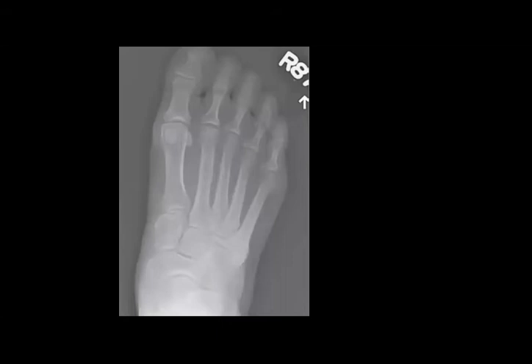So what do you think about this one? Flattening of the head of second metatarsal. This is what is called Freiberg disease. Nirmin, Ala, perfect, Marwa. So it can be bilateral in 10% of cases, which is osteonecrosis of the head of second metatarsal. Okay. Yes, Freiberg.